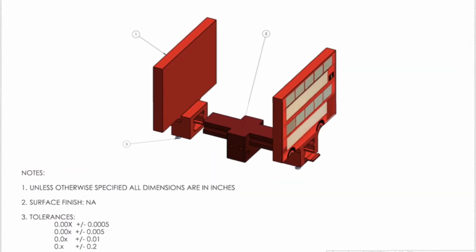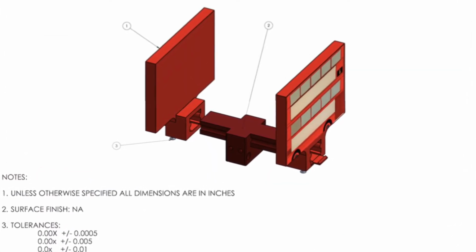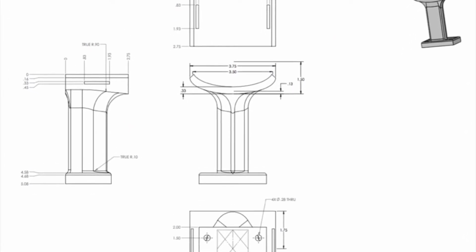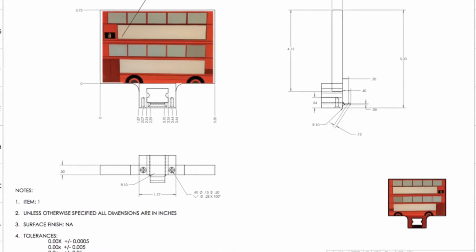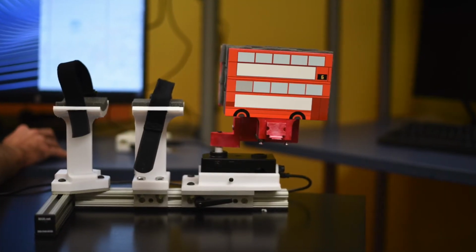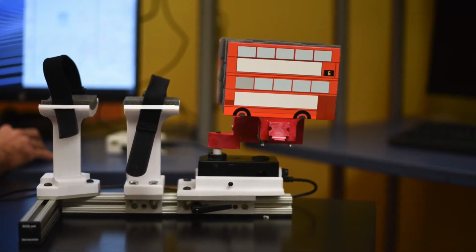We are particularly proud of the hardware component we developed for our device. We made all of the stabilizing components in SOLIDWORKS and printed multiple iterations to achieve the final product. It is adjustable and versatile to allow for patient specificity as well as being kid-friendly with the fun design to cater to the young patients that will ultimately be using it.